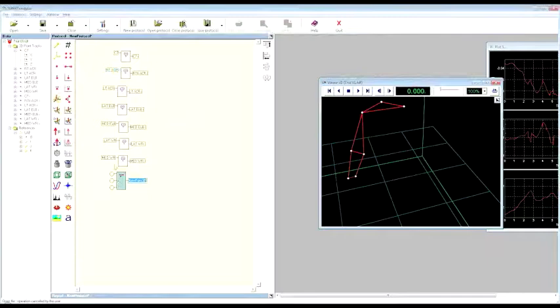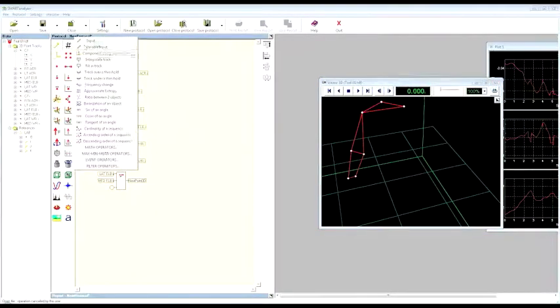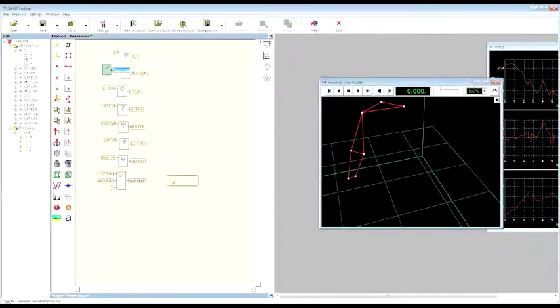As you can see, this operator requires 3 inputs. The first two will be the two markers, in this case the lateral elbow and the medial elbow. And the third point is going to be the scalar. So in this case, as we are going to compute the middle point between the two markers, we have to define a scalar whose value can be set as half, so 0.5.